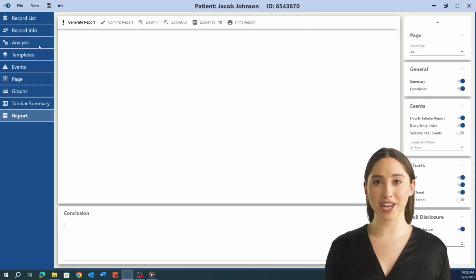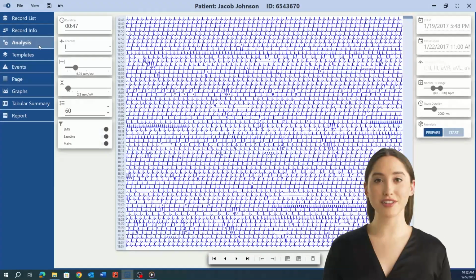NORAV NH301 Holter analysis system offers a simple and streamlined workflow. To commence the analysis and deliver a comprehensive report, follow a general top-down logic of the view sidebar on the left side of the screen. Let's start with launching the analysis.